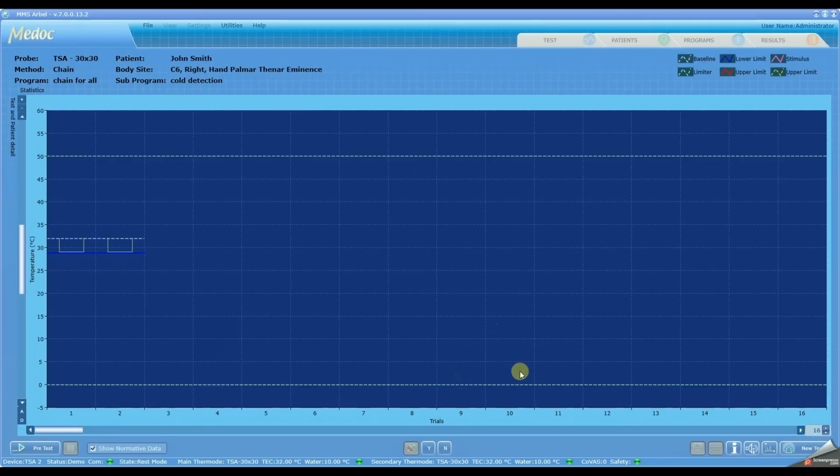Let's go to the test. Now remember that triggering you do either with the T on your keyboard or with this button over here. Let's do the pretest. Are you ready to go? So let's start. It's waiting for a trigger, and now I can use this, for instance. And let's say I felt it right now. I'm using the Y or the button on your response unit.